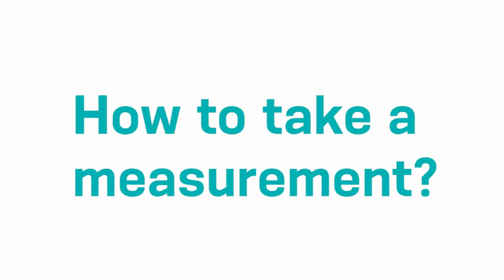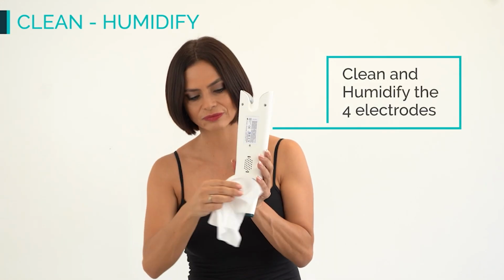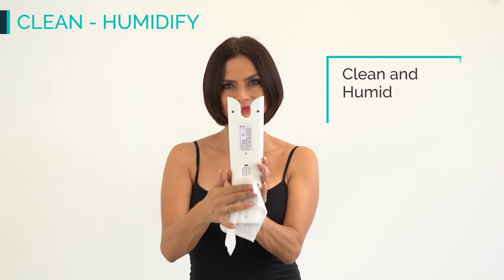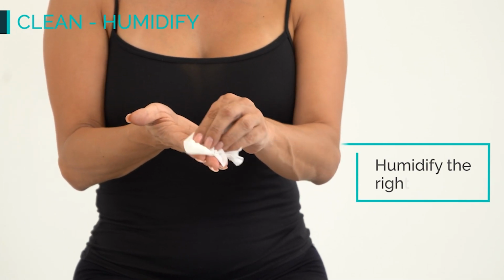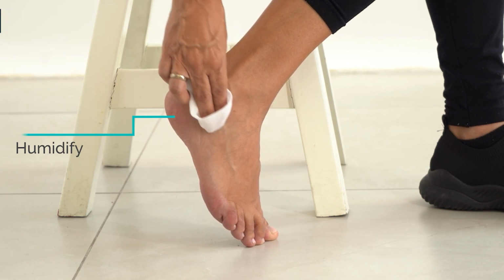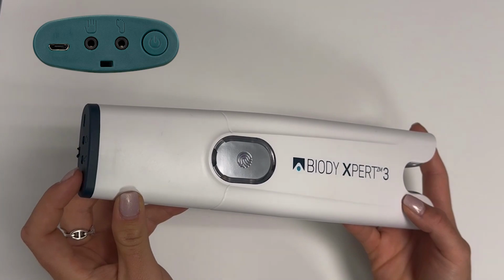How to take a measurement. Make sure that the electrodes of the device are moistened. Slightly moisten your right hand and right heel. This will ensure better conductivity and more accurate measurements. Turn on your device before taking the measurement.